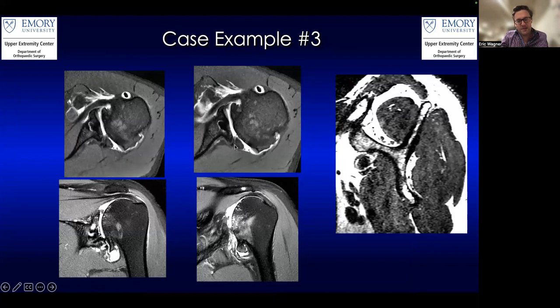You can see it wearing away the backside here. Biceps, your subscap, your infra. You can see how you're wearing away the backside here. You have this osteophyte here. You have the subchondral cysts underneath there.